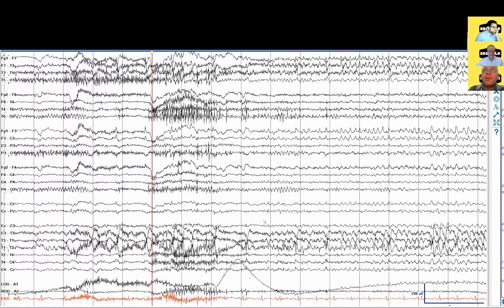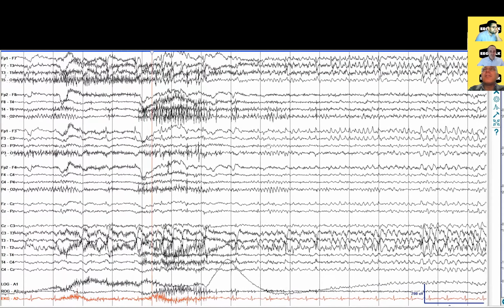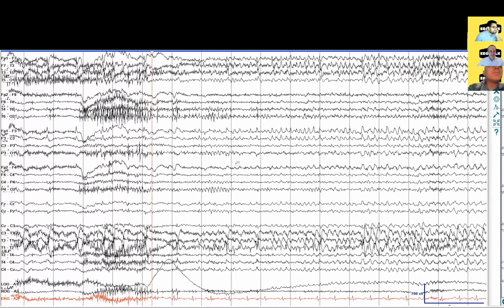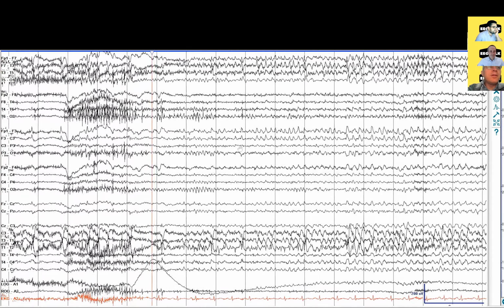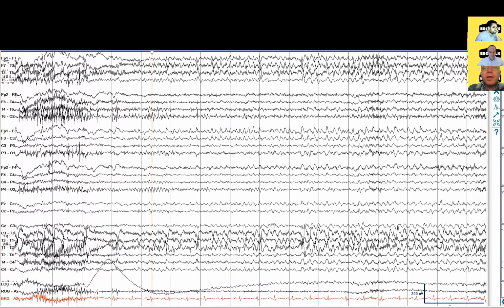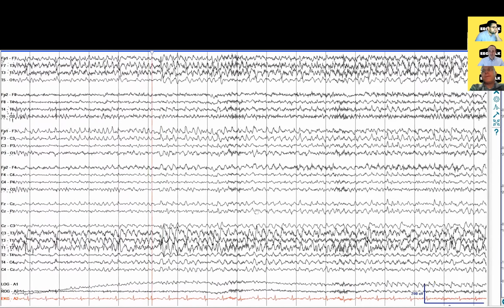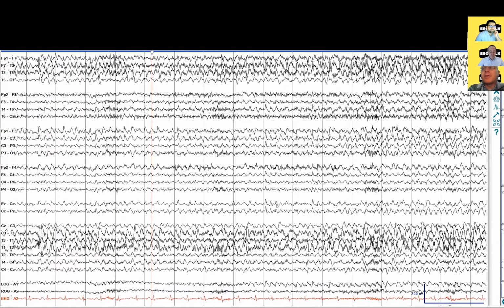Yeah. Fabio's right. There is a lot going on here. We have a left-sided seizure that looks like it's coming probably from the left temporal chain. You can see it really nicely down there on the bottom set of electrodes, around the T3, T1 derivation. If it's left-sided seizures on EEG but nothing on the MRI, that is a little concerning. I looked at the scan for hours. I didn't see anything abnormal.